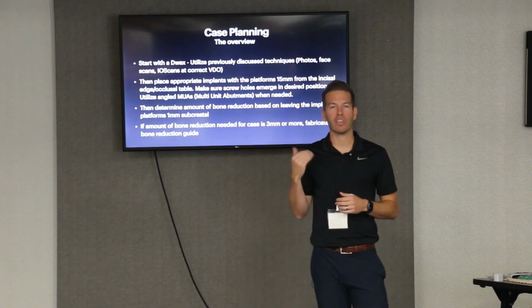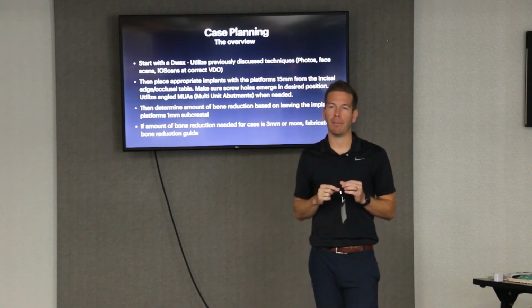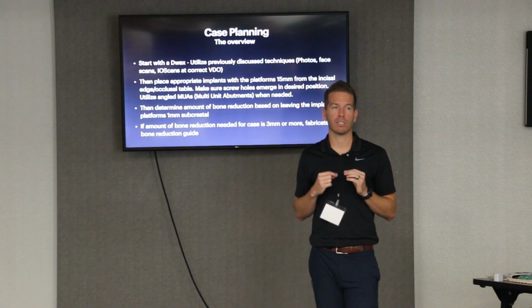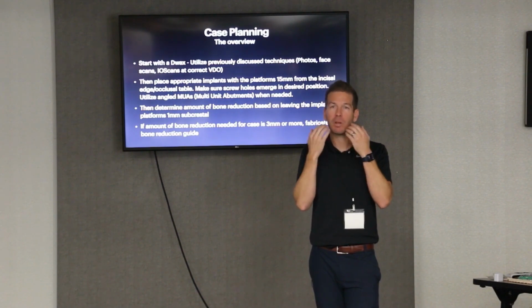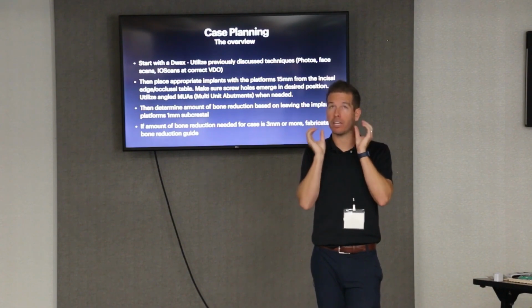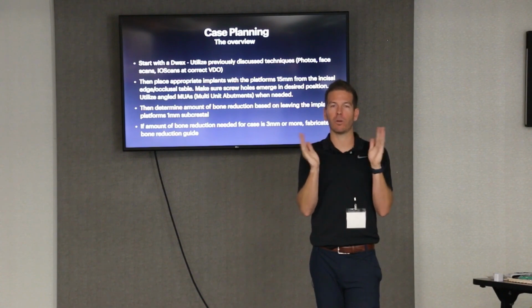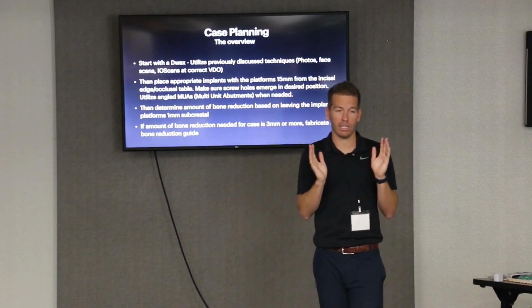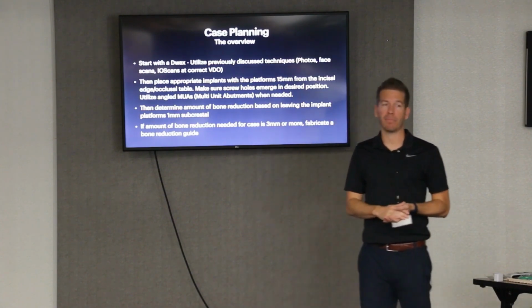Or, as you're thinking that tooth, prosthetically driven dentistry. So we're driving the tooth into position, not just the implant. And I do this a lot of times, even on single units, especially like a distal extension case where they have no teeth back there to reference, and they're just hitting up here, and you want to put some teeth in there. I'll still drag and put some teeth in the back there in occlusion with their upper teeth digitally. And then when you put your implants in, you know where they need to be. So that's, anywhere from single tooth dentistry to full arch dentistry especially, start with that wax up digitally.